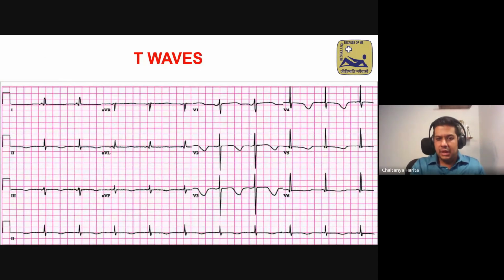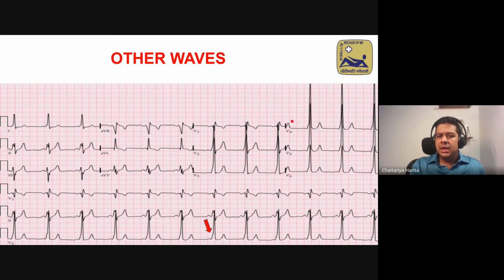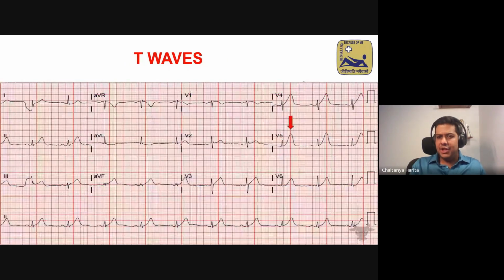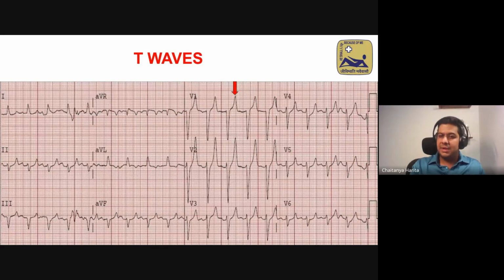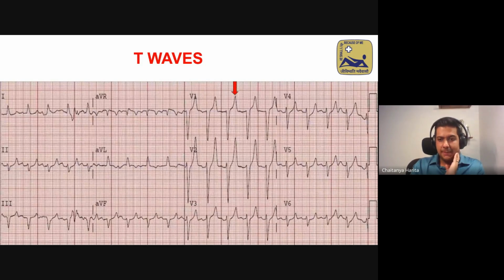Okay, very important. T wave inversions. This means there is myocardial ischemia, not death, ischemia, which you have to work up. This is how non-ST elevation MI can present. A classic biphasic T wave, again suggestive of NSTEMI, can present with this type of T wave presentation. So you've covered biphasic T wave, T wave inversion, tall symmetrical narrow, covering all the types of ST-T wave changes that you see.